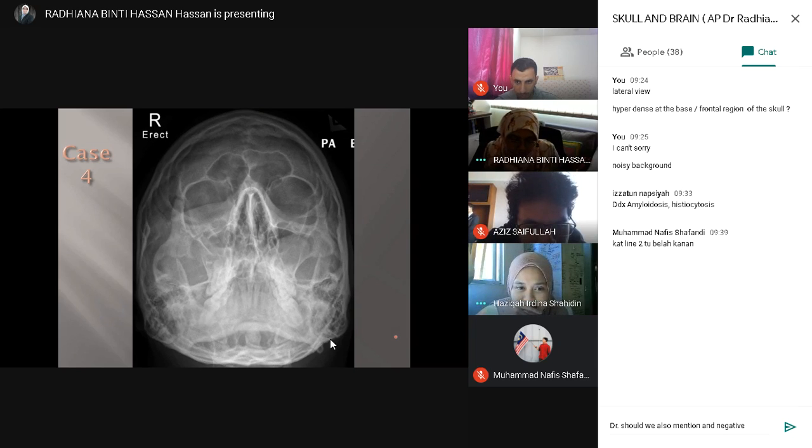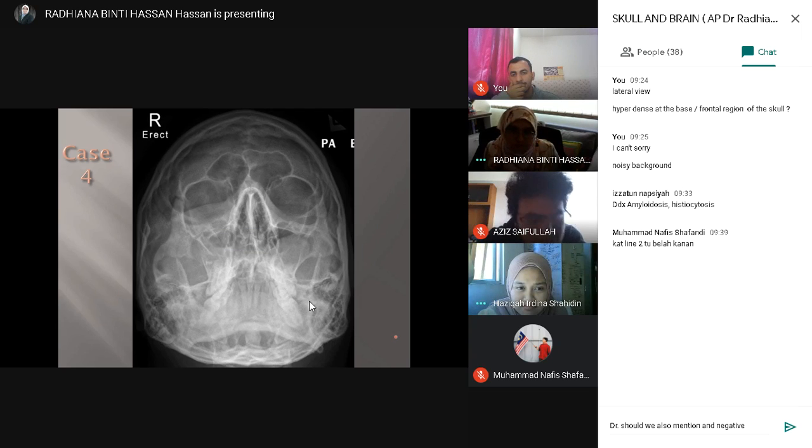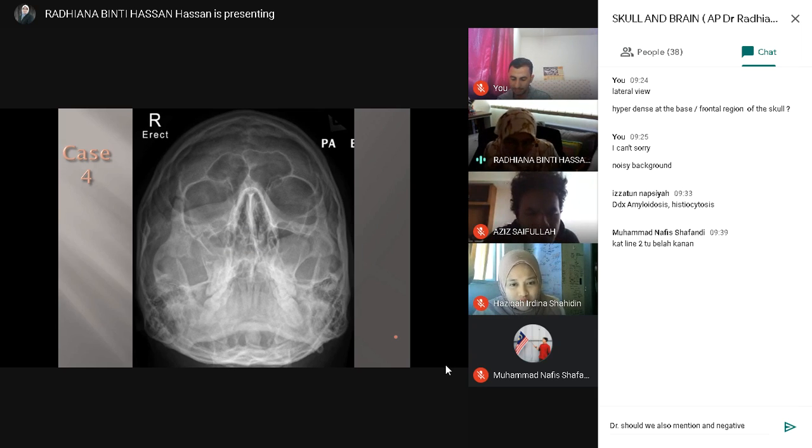I'm not sure. Okay. So this you must complete until giving me the diagnosis. So the diagnosis would be frontal bone fracture. Anybody else want to give your interpretation?